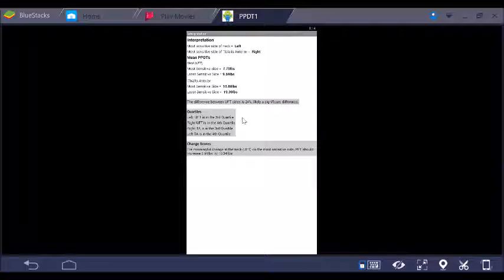Now, if this said it was in the 1st quartile, for example, that's in that lowest, the 0 to 25th percentile of our normative database. That would suggest the person is sensitive in those areas. And you may decide that if they're both sensitive around the upper fibers of traps and the tibialis anterior, that might suggest widespread mechanical hypersensitivity.